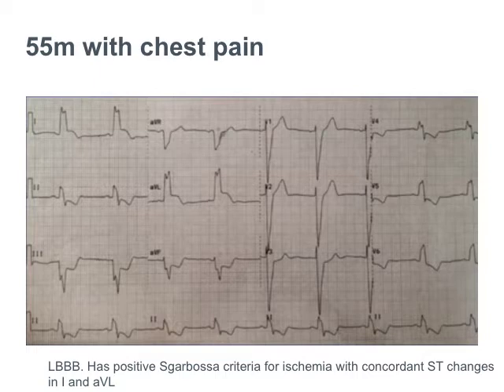So you're looking at this saying, okay, I've got a left bundle branch block. And you know that, if you recall, in left bundle branch block, we have this problem in that you have an odd depolarization of the left ventricle, you also get this very odd repolarization of the left ventricle. And that kind of messes up our ability to look for signs of ischemia. But we've managed to work some predictive technique out, which we're going to go through momentarily.